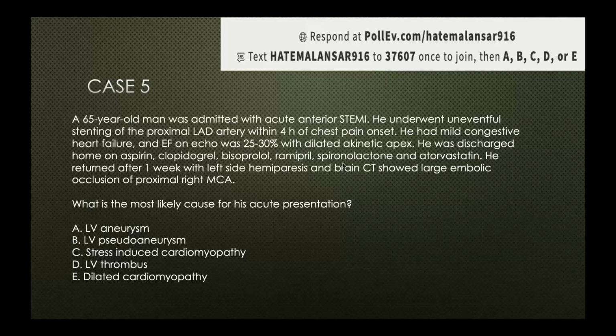Yeah, so again, you got the answer right. This is a patient who has anterior, severe LV dysfunction, akinetic apex, presenting with a new stroke. The diagnosis is consistent with LV thrombus.